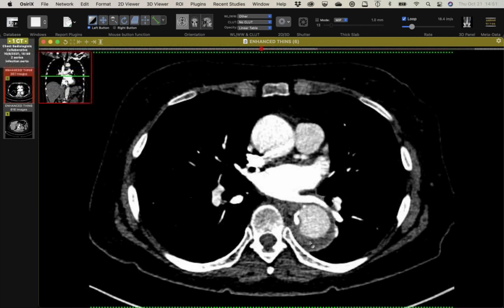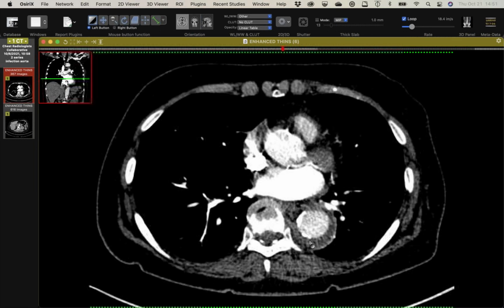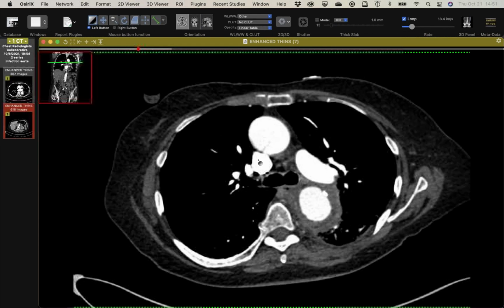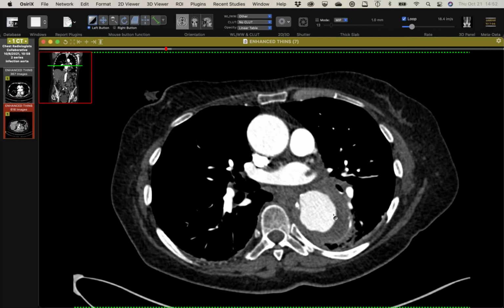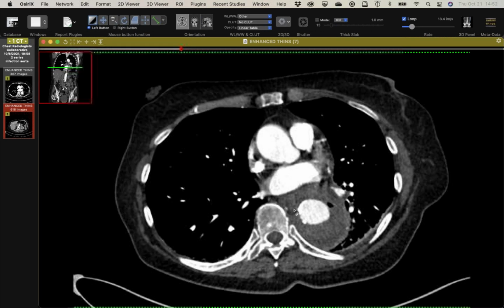This was all from the outside, so I don't know what they said or did, but the patient was eventually transferred here, about a little over a week later, and was developing fever and not doing so hot. And so the CT looks like this, and we can see there's actually increased thickening of the wall of the aorta, and there's gas in the wall of the aorta, little bubbles of gas, which is not good.